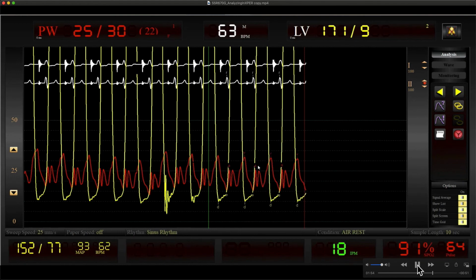And we don't see any gradient highlighted. We hit the valve picture button here. That gives you the gradient. Now we have the gradient. It says the mean is 10.8, but we thought it was 8. What about the timing? Timing is off. The wedge is too late, and there's no A wave on this picture, so timing is wrong. We have to shift it.